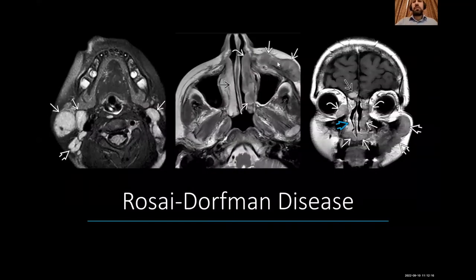Here are the examples. This is the extranodal. This is a node and this is the extranodal. Just to explain these points.